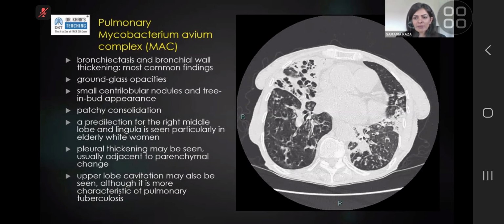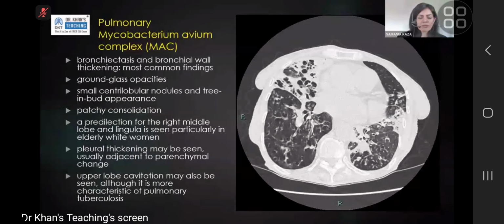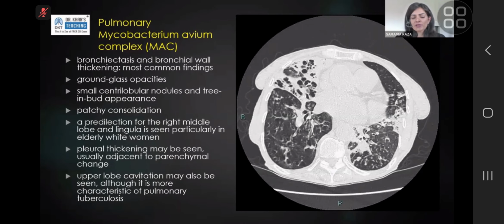NTM patients are usually generally well. They're chronically slightly unwell. They come to respiratory clinics. They have outpatient imaging, and a CT is usually much milder than the CT I've put up. So the most common distribution is they have a bit of bronchiectasis. It's more predominantly involving the middle lobe or the lingula. You have a bit of tree and bud nodularity. You have a few nodules, some of which look like they're cavitating. So that's when you have to bring up the likelihood of NTM infection. When you say NTM infection, that patient, if they haven't already been referred, needs a respiratory referral. They need endobronchial sampling for further management.